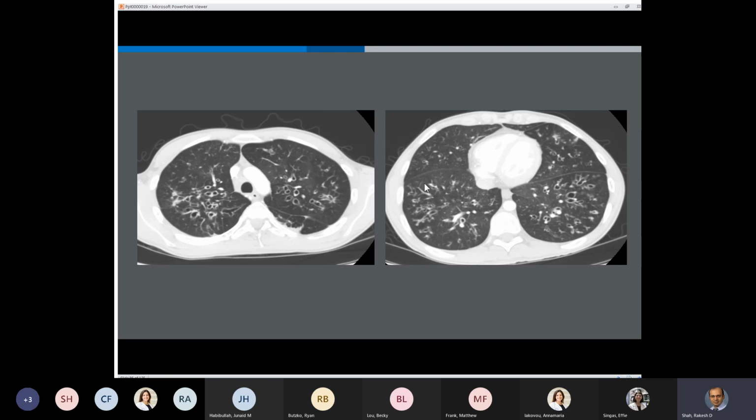So this is bronchiectasis throughout the lungs. And if you see this in a young patient, and I'm sure you see, because I think at Cohen's we have a lot of individuals that have this, and the distribution is upper. This is cystic fibrosis.